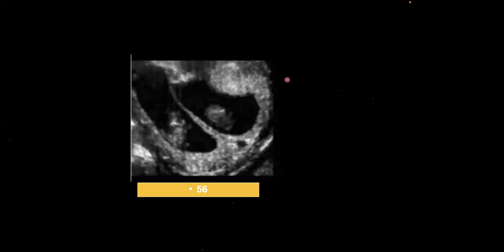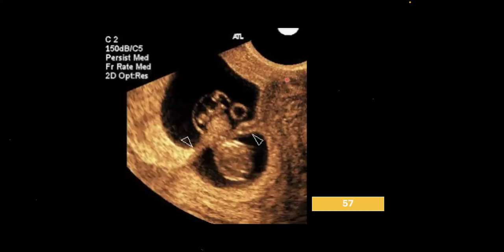An easy spot of 56. Come on, tell the sign quickly, one of you. Very good. 57. What do you think this is? Around the fetus. 57. Apurva, very good. Apurva Thakre.